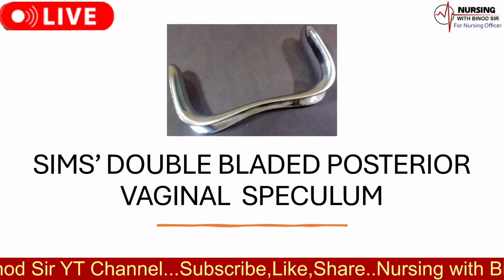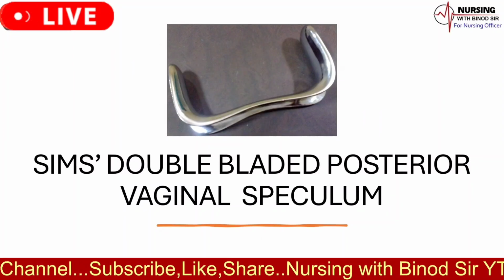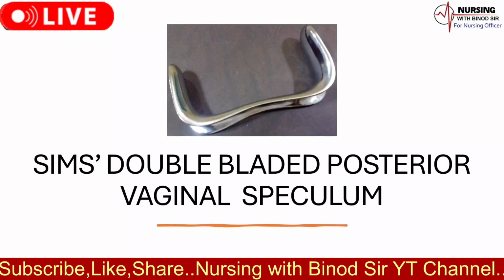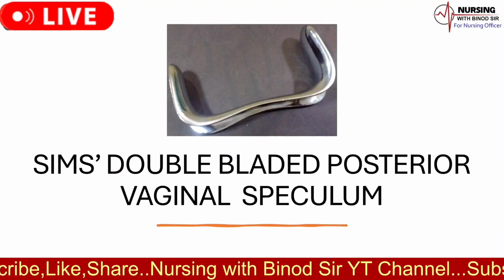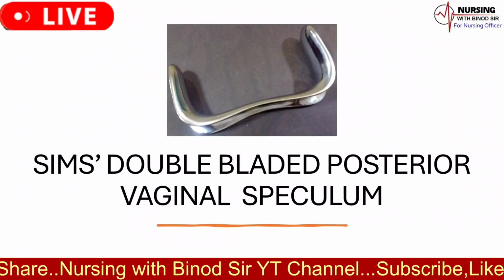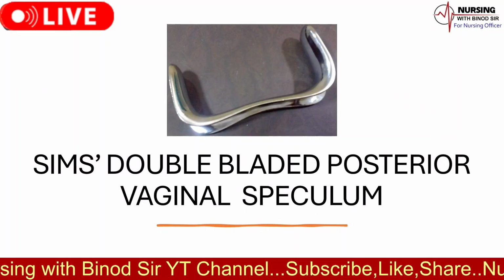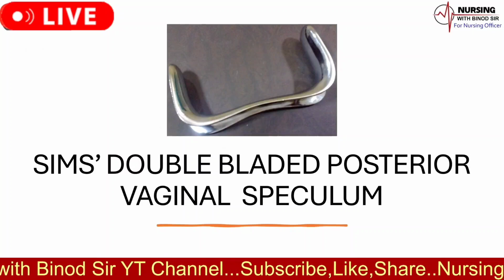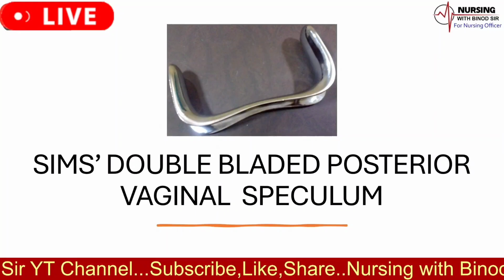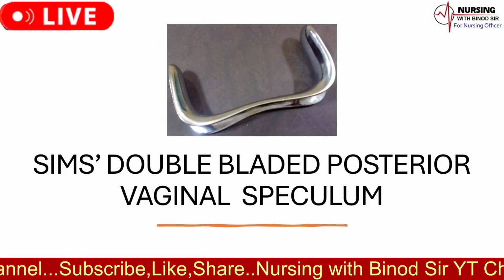The uses of Sims double-bladed posterior vaginal speculum are as follows. 1. To inspect the cervix and vagina and to detect any injury following delivery. 2. To clean the vagina following delivery. 3. To inspect the cervix and vagina to exclude any local cause for bleeding in APH; Cusco's speculum is preferred. 4. During D and E operation.